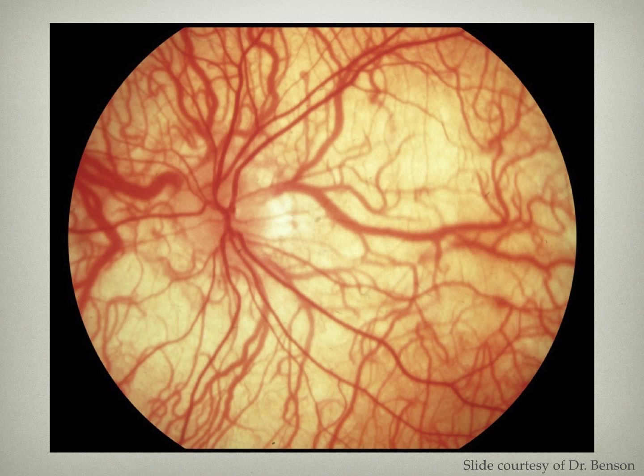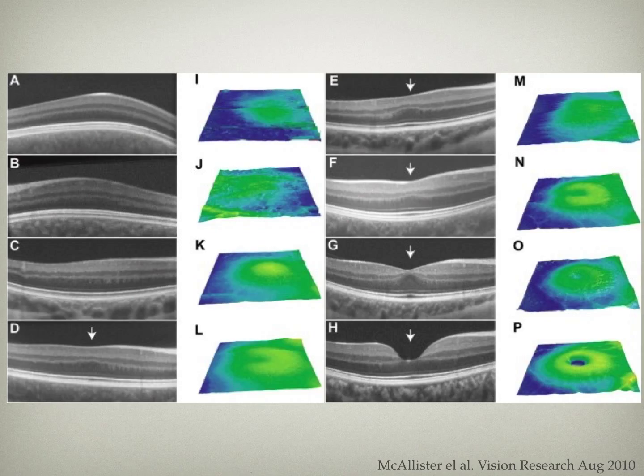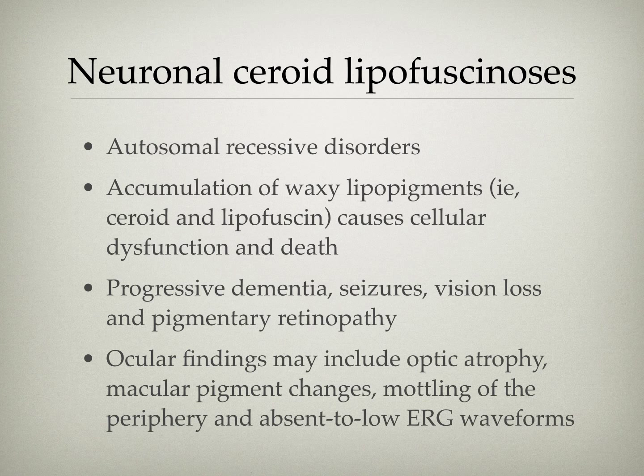Now this is more your normal albinism type picture. And then they also get these very interesting findings. One of the residents just presented a couple of our patients not too long ago. It wasn't one of you guys. But they just get the loss of that normal foveal contour. And people have staged it out based on which layers are present in the fovea that shouldn't be.